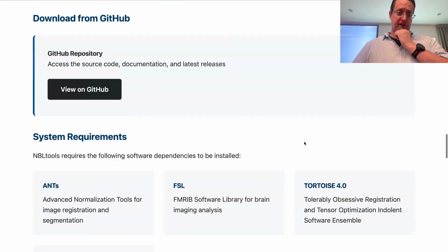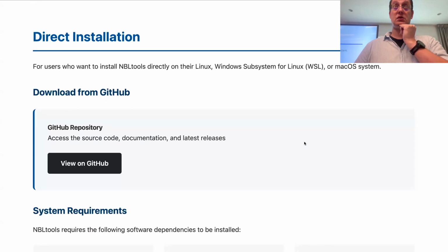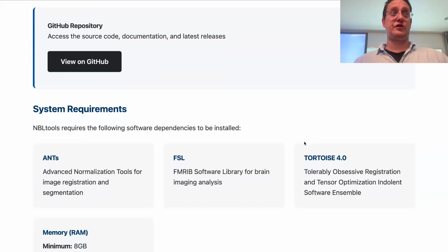I think I kind of covered everything. Any questions so far? Good. So at the end of the day, when you're all sorted, it's one command: run all, the number of subject, and all the options that you want to do. Yes, for the multi-shell data? Yes. Where is that? Yep, exactly the same.